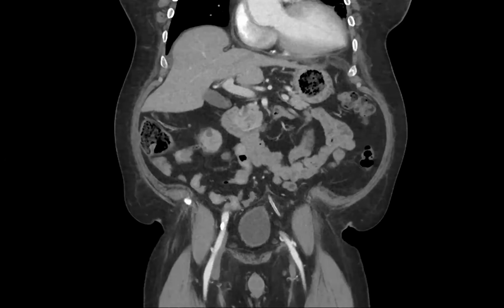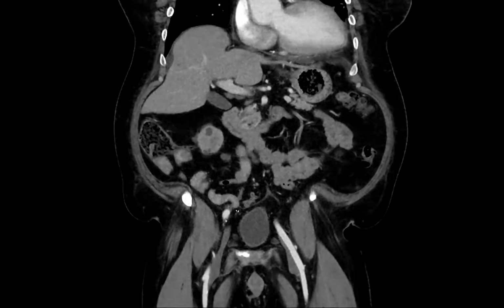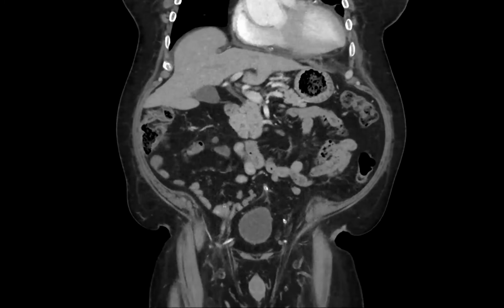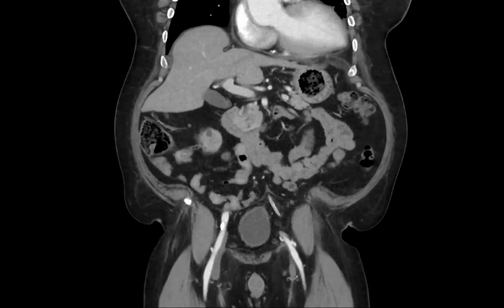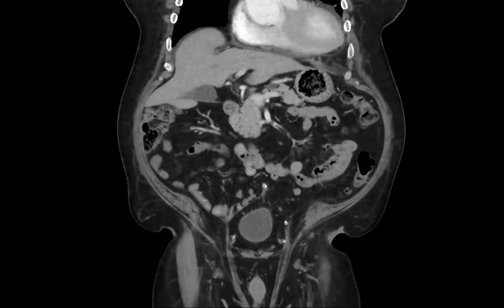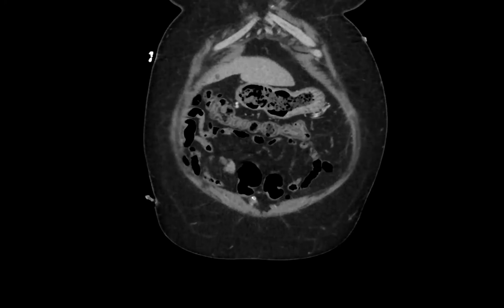So I see additional nodes. Yes. I don't know if this is helping or hurting, but like a carcinoid or something. Yeah, exactly. And actually, if you're kind of awake and on it, you can maybe hallucinate something there. And so yes, all these things were unexpected. And I'm going to share with you the dotatate that outlines the multifocal nature of this.